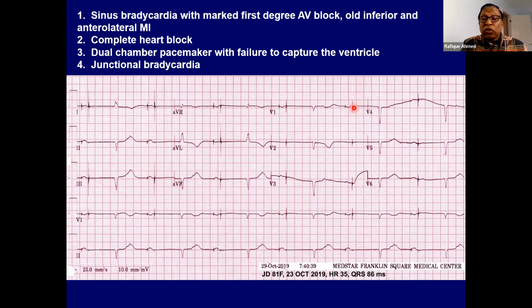Exactly, pacing spike. So my question was, why is it pacing here? Why not a little outside? It should have been 1 second from here, but the ventricular timing is correct, and it is a ventricular base. So why did it happen? One possibility is just that the threshold has increased. Number one, maybe the pacemaker is set at 2.5 volt, and the threshold is 2.7 volt. So we can change the pacemaker program.